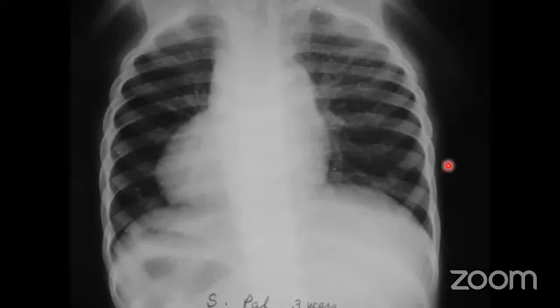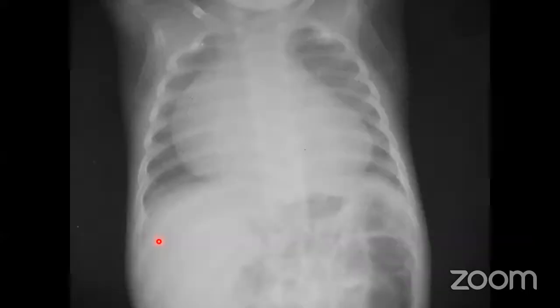And possibly you have seen it in the previous thing. It's just a recapitulation, because in the ECG and the echocardiography, we have already shown you this exercise. I'm going first. This is the right apex of the heart, the heart is on the right side, and you can see the fundal gas. So this is the dextrocardia with situs inversus. And this is a huge cardiomegaly.